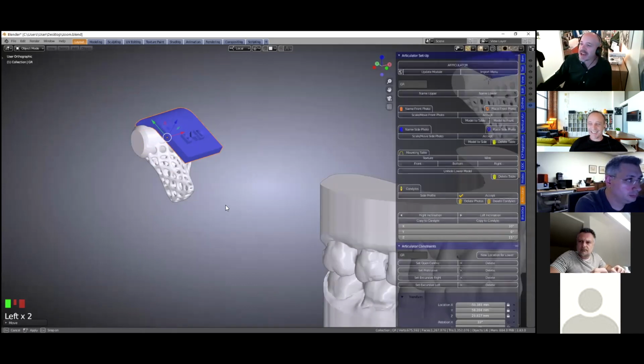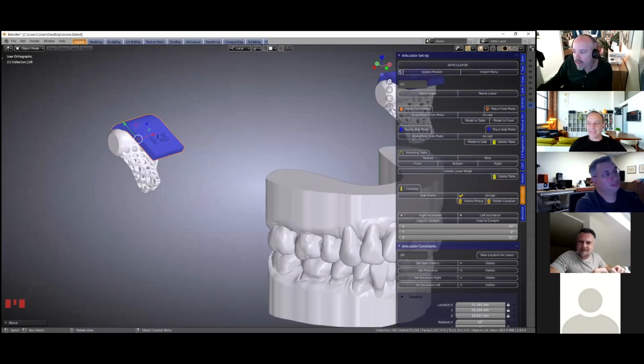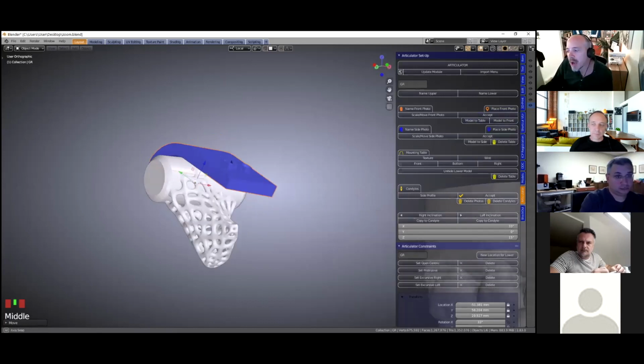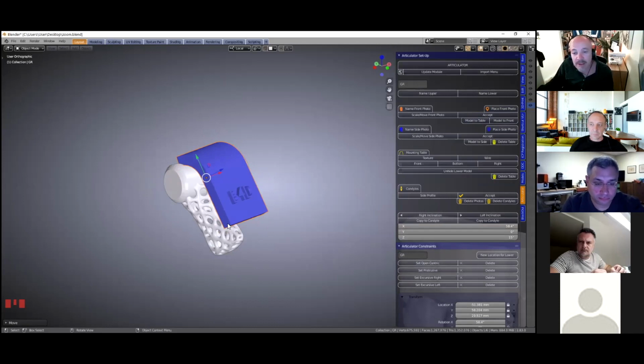Okay. The friendly sign, so that's good. So we've got that 33 degrees and 15, but this is the articulator eminence, the TMJ eminence, and we wanted to move down the slope. Hypothetically, if you want to test it yourself and do something like this, radically, you will see that this white condyle is going to, in fact, travel down exactly the same path.